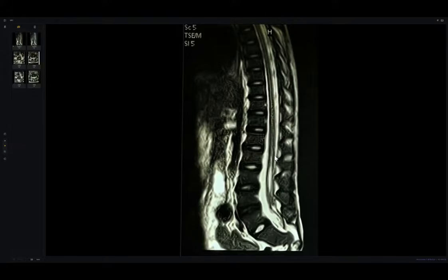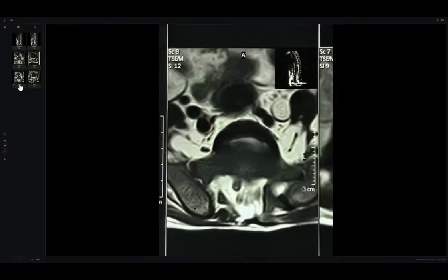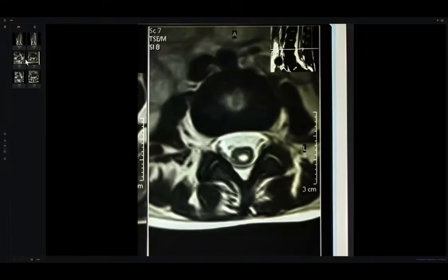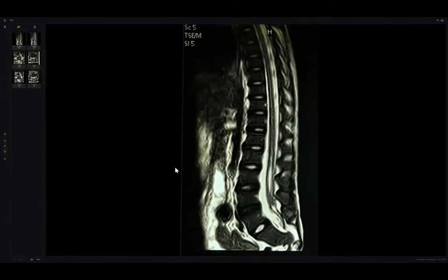And besides that, there is syringomyelia or central dilatation. In addition, there is a defect here. Even we saw it in the X-ray. Also, we should tell the examiner, doctor, I want the rest of the exam to rule out any vertebral anomaly like butterfly vertebrae or hemivertebrae or what else. Okay, my colleagues.